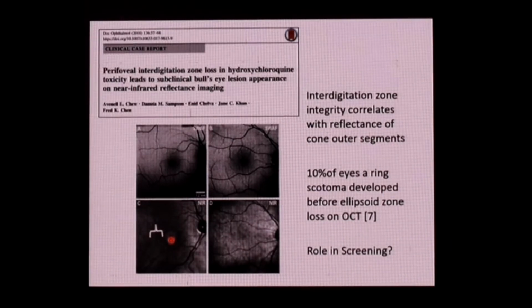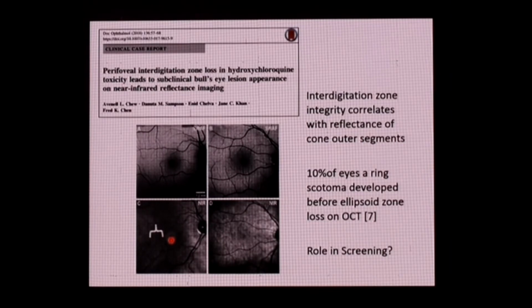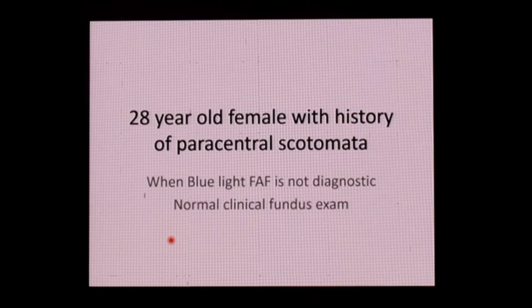So it may be useful in hydroxychloroquine screening, and it has actually refocused our minds on what to look at in the OCT, to look at structural changes in the interdigitation zone, and maybe some sort of en face of that would help in our screening of hydroxychloroquine patients.